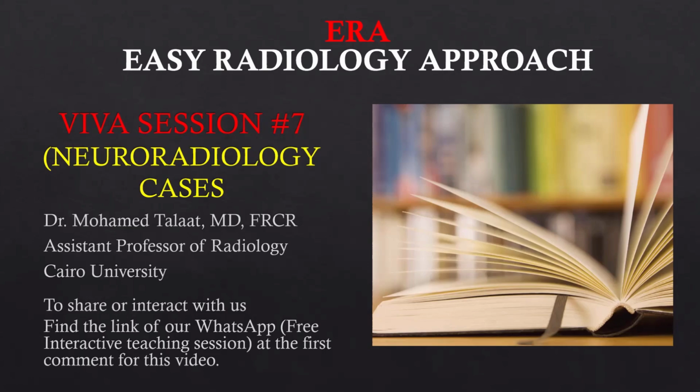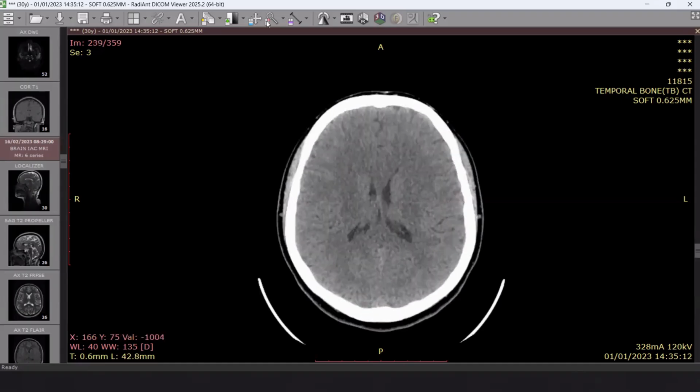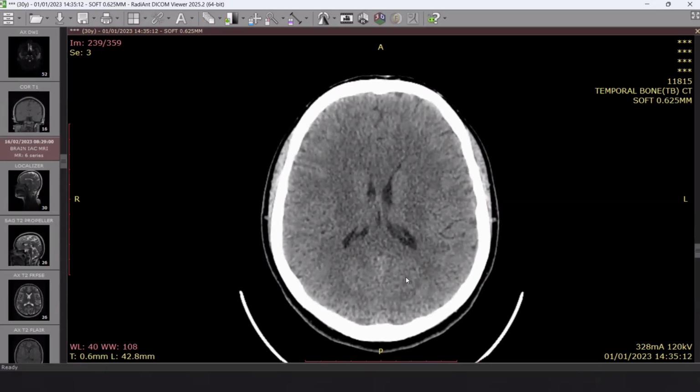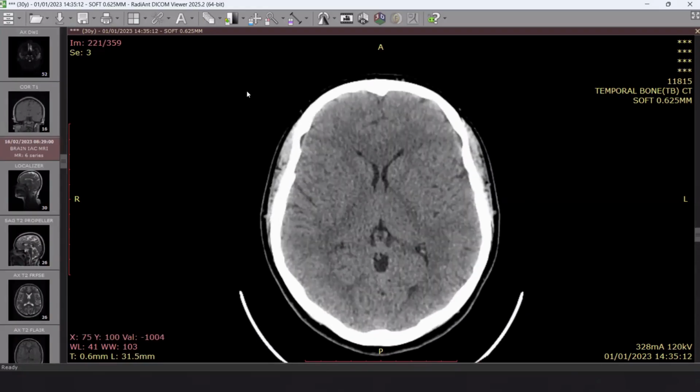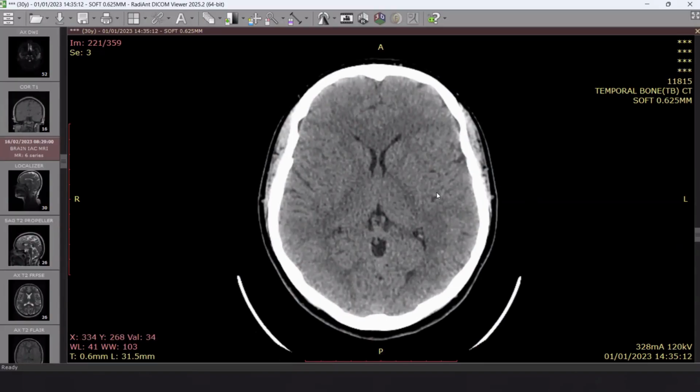Let's go to our cases today to save our time. Let's start with candidate 1, a middle-aged patient complaining of headache. If you want me to scroll, okay, as you like. Sir, I would like to scroll if you are happy with that. Okay. Sir, I'm okay, requesting control. Yes, okay, go on.